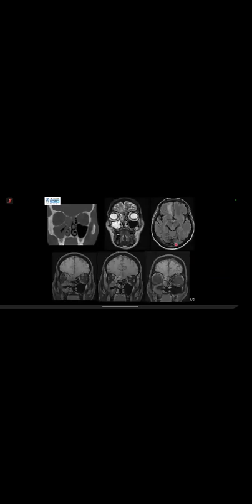If you look carefully, this is the medial rectus, and you can see another opacity here. And this opacity is because of this subperiosteal abscess. Depending on the scenario, you should ask for post contrast, and you can ask for MR if the symptoms are because you have to rule out intracranial extension.